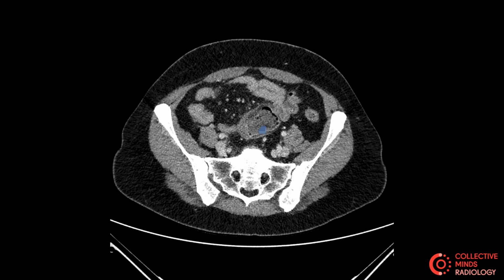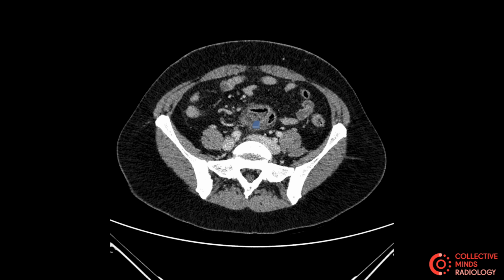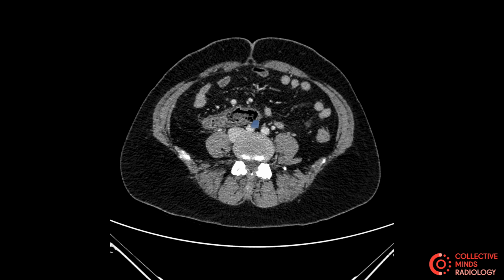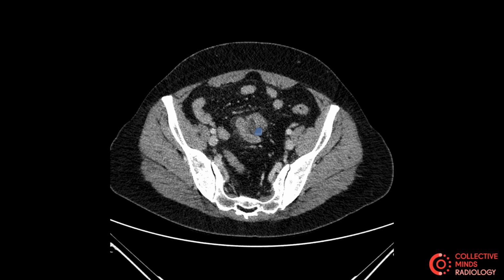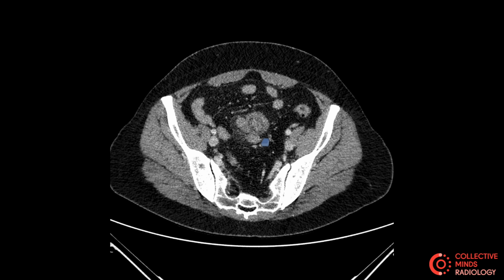So that all looks okay, but now we should follow a bit further down. As you come further down from the cecal pole, coming down, coming down, further down, you start to see another tubular structure curling around this way and coming off. And this structure doesn't seem to go anywhere else and is coming off the tip of the cecal pole.